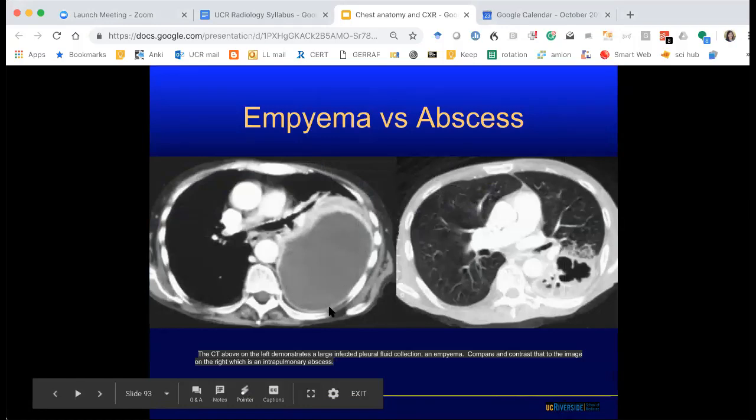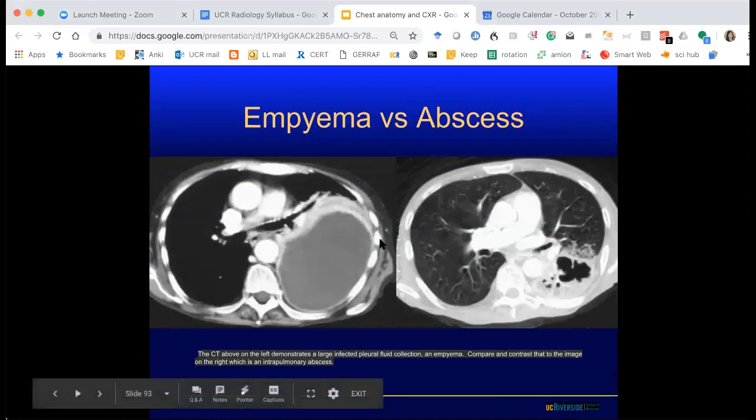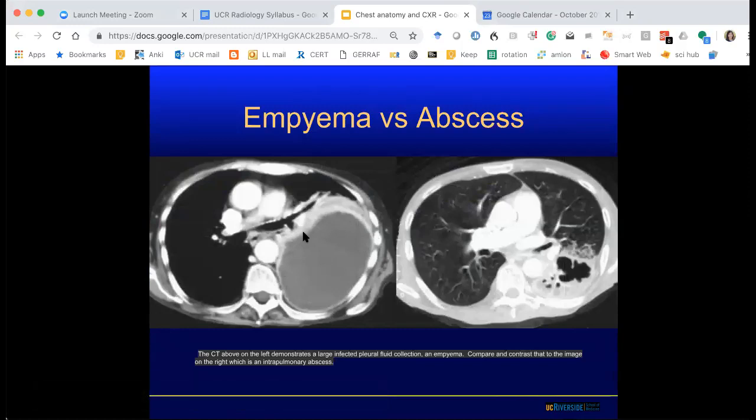So here, there's an effusion. The pleura is enhancing. This is a contrast enhancement because the aorta is bright. And you see that this has a bulging effect. The fluid is not simple. A simple fluid would be isointense, and this one is a little hyperintense. And with the thickened enhancing pleura, you're worried about a non-simple fluid. So in this case, this is empyema. Empyema is basically pus, like an abscess in the pleural space.